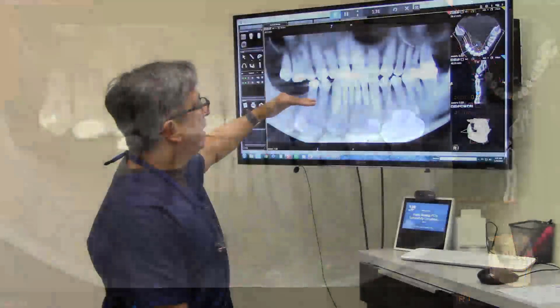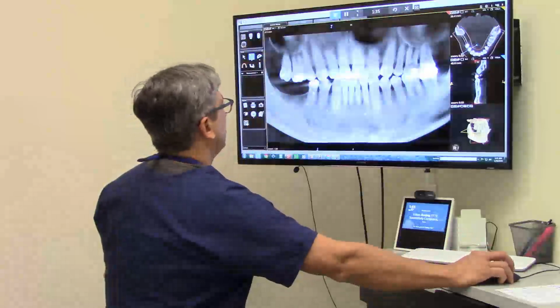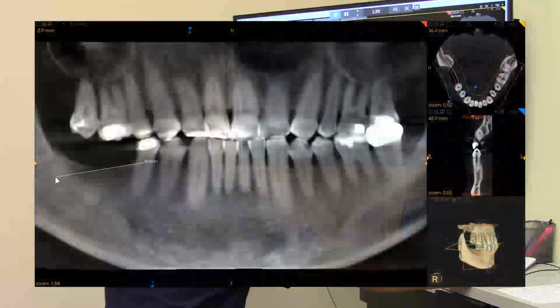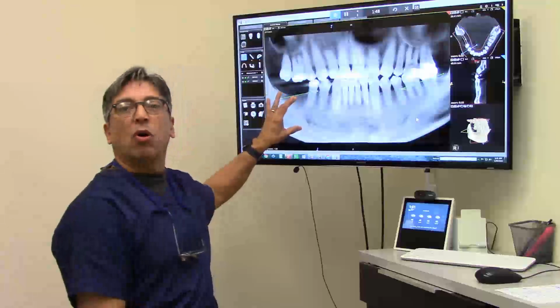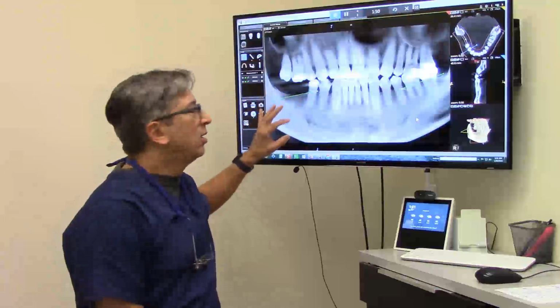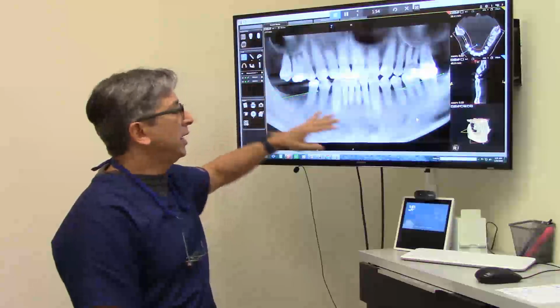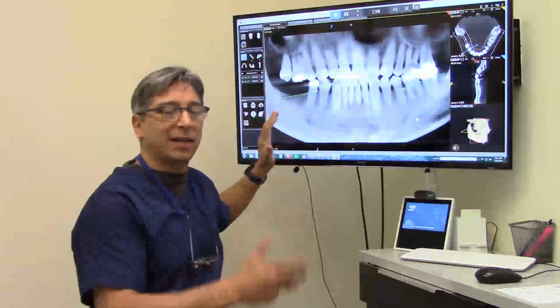But when you come here, his bone actually starts to slope down away from this tooth. So if I go premolar, it's getting more of a slope this direction, whereas from the same premolar, he has a slope in this direction. So this turns into more of a yellow, only because it's not going to be a green, because it's actually changing to his opposing side. So it's not exactly the same.